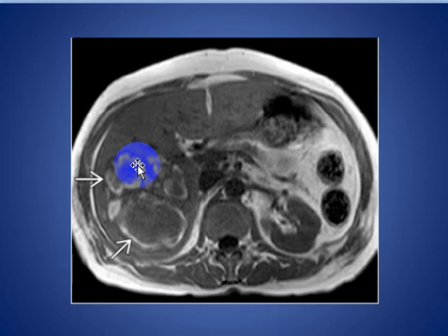An unusual feature usually indicated a proteinaceous material or hemorrhagic fluid.